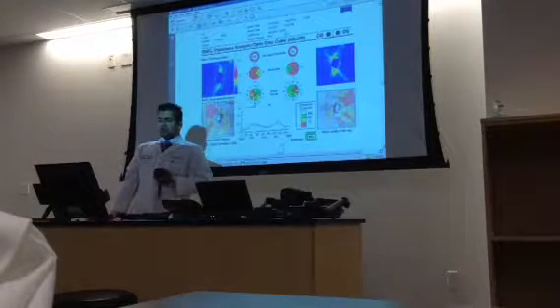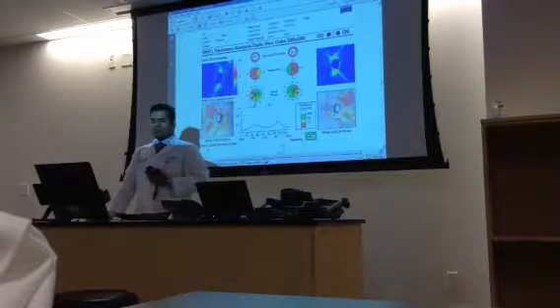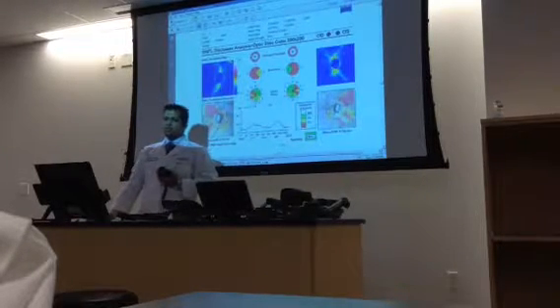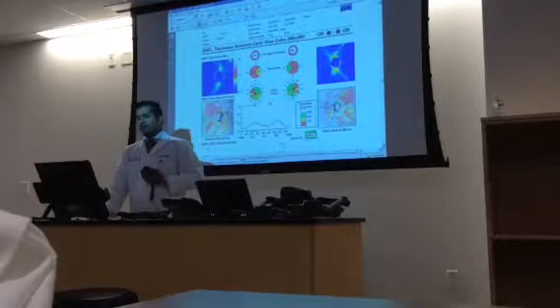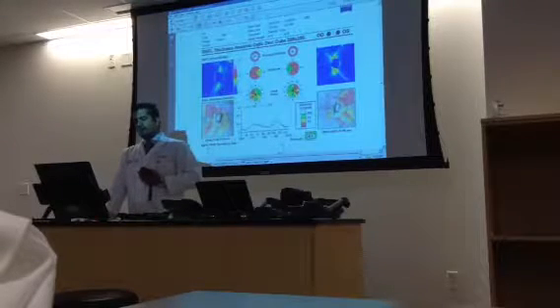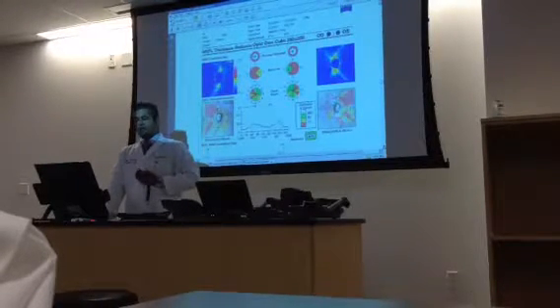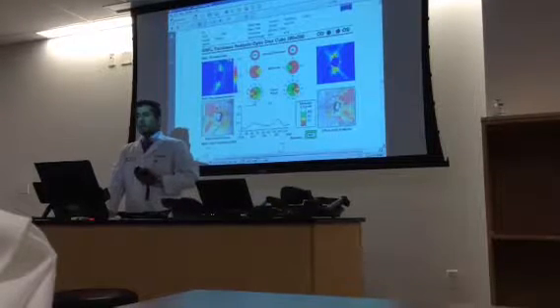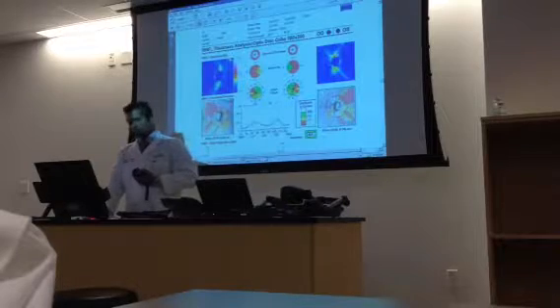Inferior average is also color-coded like the other quadrants, but if you ever want to know, when it starts getting close to 93, there's a chance that it is getting towards glaucoma. So inferior average, and it's low, then that's one of the most diagnostic parameters of diagnosing glaucoma. You can write the same story based on the nerve fiber layer measurements in this region.